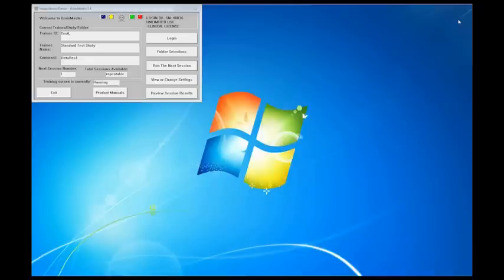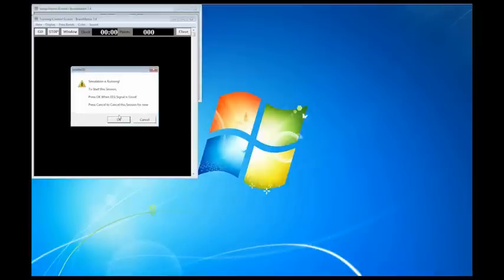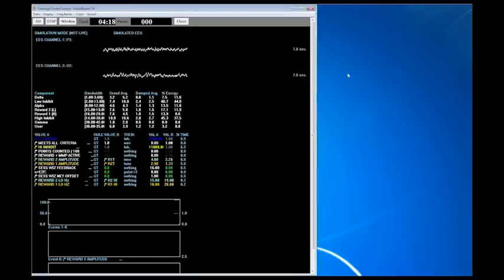I know that we've put it on some different things, but I haven't been able to actually... oh, you want to see the rest of it? Okay, well, I'll keep running. I apologize. I have no problem letting it run through while I'm answering different questions. We'll start from square one, but it's fine to do it the exact same way.